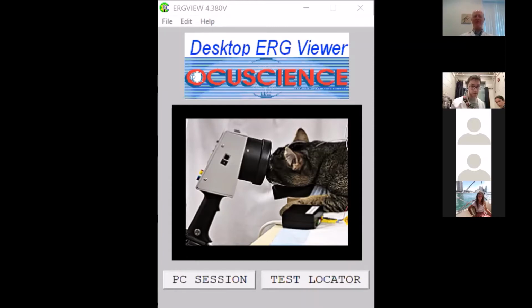Right now, I'm going to go through data analysis of ERG, and I'm sharing with you my screen of our ERG View software.